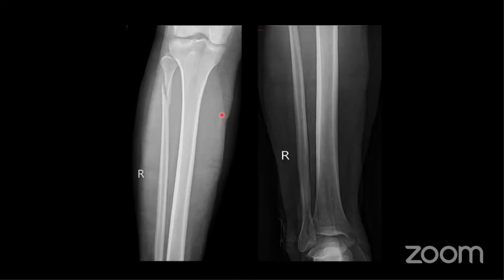Right, okay. So to recap, this is a Maisonneuve fracture. There's two injuries, proximal fibula and the ankle. The injury at the ankle doesn't have to be the medial malleolus. It can be injury to the tibio-fibular joint, so just widening of this space here. It could be an injury to the medial malleolus, or it could be an injury to both malleoli. But it's a combination of a fracture up here and some kind of widening of this space that manifests as the second injury.